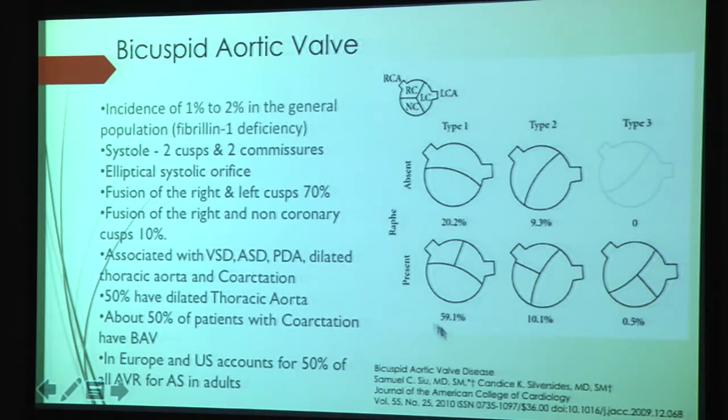The most common one is the fusion of the left and the right coronary cusp. The next one is between the non and the right coronary cusp.